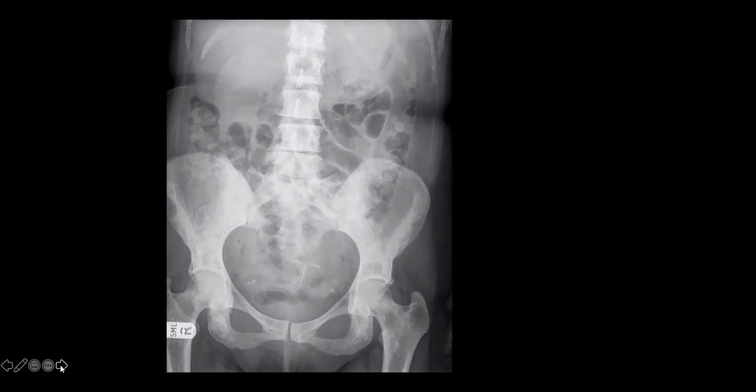And that allows both clinicians and radiologists to comment on a wide range of bony pathologies, including fractures, osteoarthritis, Paget's disease, and bony mets. So just looking at this radiograph at the moment, I think there are two main findings that I want to talk about. One is, if you can see, there are multiple focal sclerotic lesions within the bone. And this patient has a history of breast CA. So this is essentially showing bony mets.